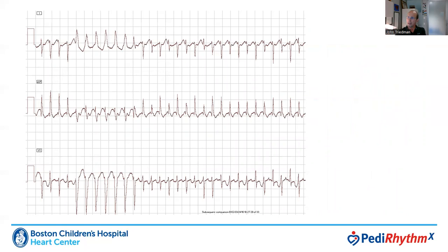There are some other things that we can encounter adventitiously in the electrocardiogram, and whenever we see something change in an SVT or in any type of tachycardia, we should always ask ourselves, how can we use that little transient event to tell us something? And here we see an electrocardiogram which goes from narrow or usual complex to a left bundle branch complex and then back again. So we have two different states of the tachycardia. The question is, is this an AV-NRT or an accessory pathway tachycardia? And what can we say about the tachycardia beyond that?